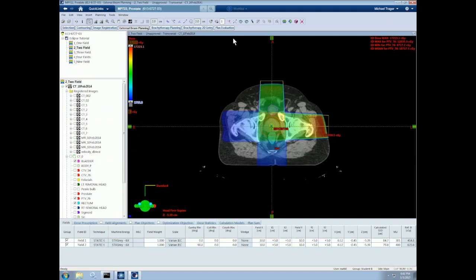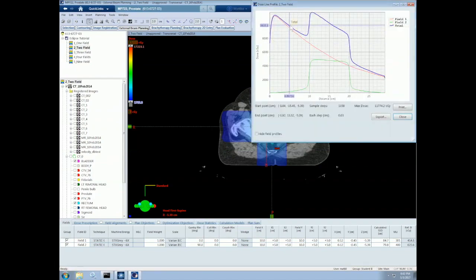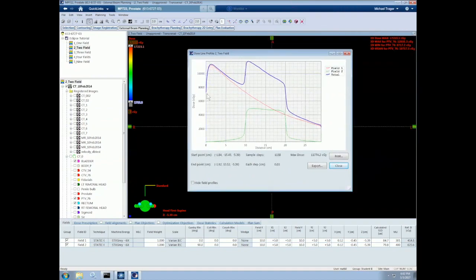Let's draw that dose profile from the same beam as we did before. In blue, we have the total PDD. So as you can see, we have that same shape, but then where the beams are superimposed, we have a large increase in dose. If you look at the red curve, however, this is the original PDD, so that does not change. We're just seeing the effect of superposition.